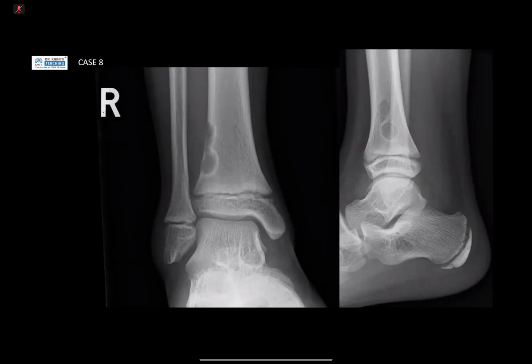Okay, good. So we'll come on to osteoid osteomas later. But you nicely described the non-ossifying fibroma in this distal tibial metaphysis. They tend to be long lesions, eccentric in place. And this is a nice example of what's described as a bubbly lucent lesion.